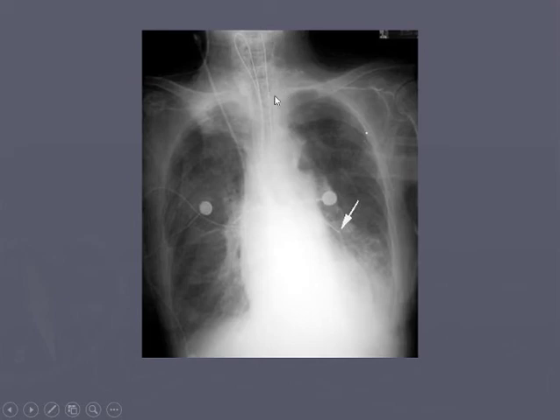We look at our bones, 1, 2, 3, 4, 5, 6, 7, 8, 9-ish. Diaphragms are fuzzy. Can't really see a diaphragm down there. Okay, so very hazy, not very distinct. Wait, I forgot our C. Forgot the cardiac. I'm sorry.